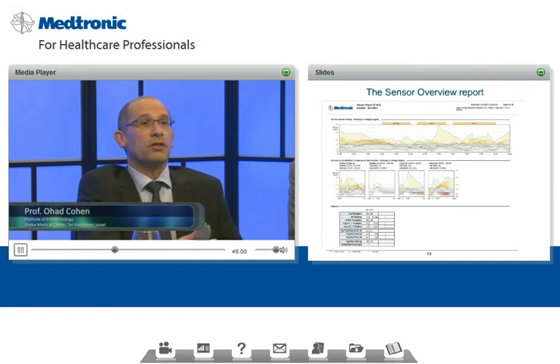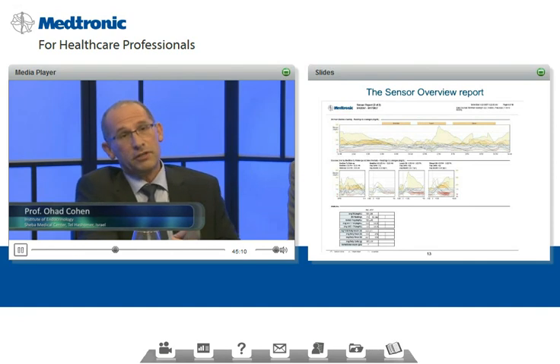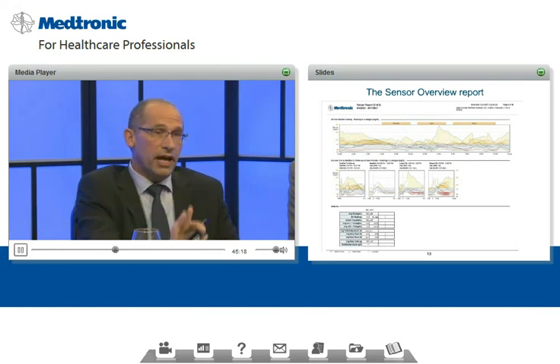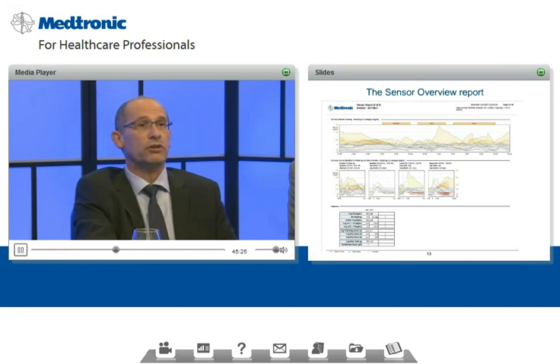It gives you a more topographical map of the blood glucose levels, where the glucose is high many times during the day. It gets darker, like in this case during the night. And after the meal, if it only went high once, like in this lunch meal that we see, it's very light. That means that there's not a major issue with lunch, and it was a one-time occurrence that you don't have to deal with, and you can continue to the next report.